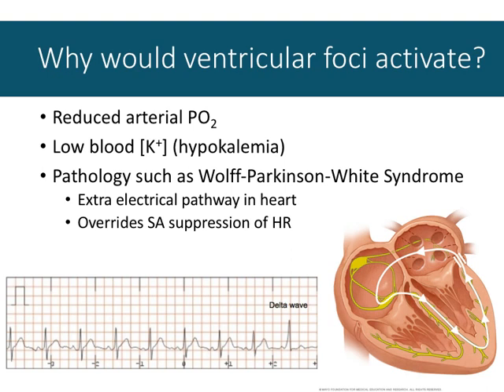And it's rare. It's not a common occurrence, but I don't want to say it's easy to diagnose, but there are some characteristic traits that make the diagnosis more likely. And it's this, you can't even really see it. Let me take that box off.